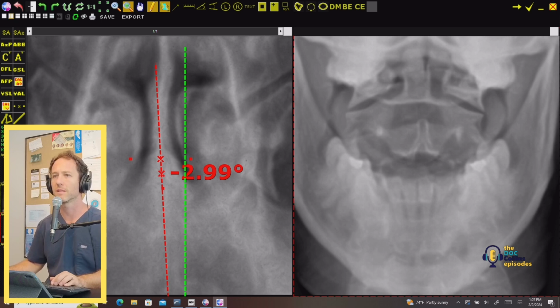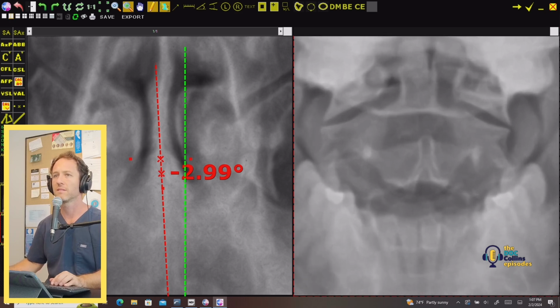And the idea is because you have a 46-inch distance, Bucky to tube, source to image distance, object distance, you should be able to have similar measurements, at least ratios, to try to find structures. Good example, like the width of your dens at that base.